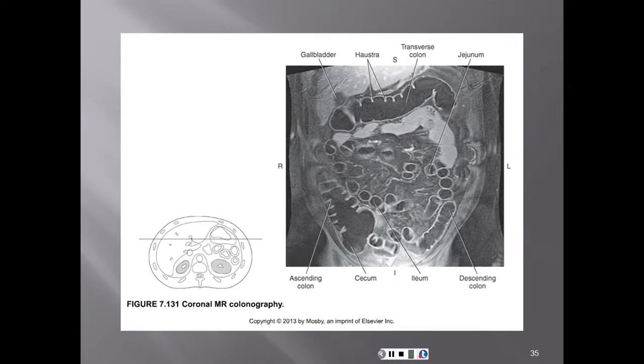Coronal MR colonography. Colonography is a hot topic now. Direct visualization is the gold standard. However, CT colonography is quickly approaching that gold standard. MR colonography is behind, however, as you can see in this image, rapidly gaining a foothold in that market.